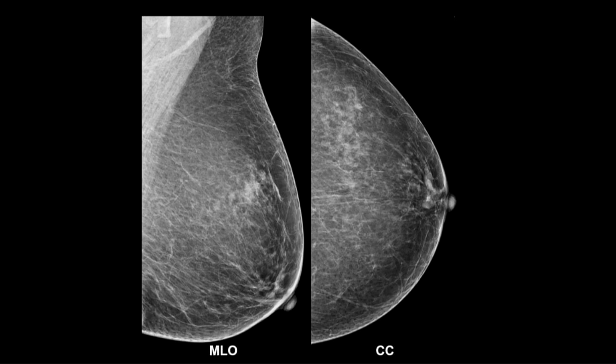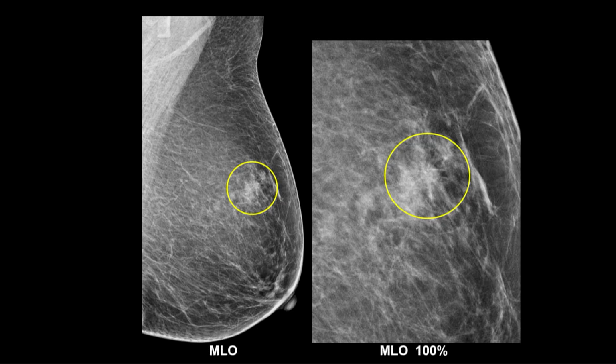But what about the other breast? That was the obvious finding. That's the thing you'd see first. But what about the other breast? Well, she has another. Let's hit the right button. Another asymmetry, but this one's on only one view, and it's smaller. So the other one you're going to see first because it's bigger and it's on both views. But this is actually in a completely different place. The other one was over here. This one's way up there. So you might discount it as being, well, but it's a one-view asymmetry.